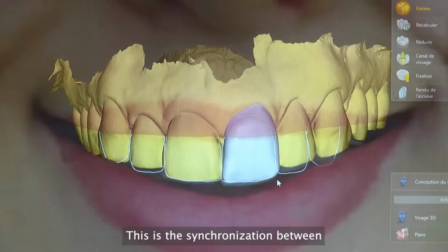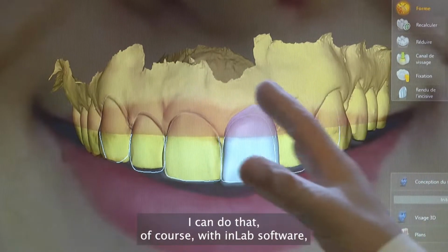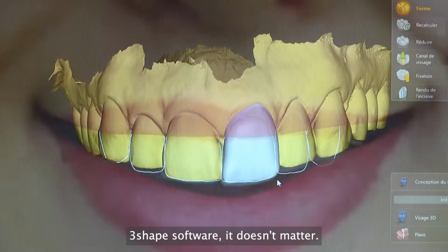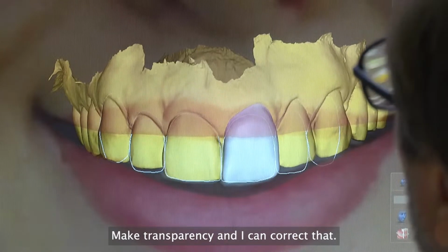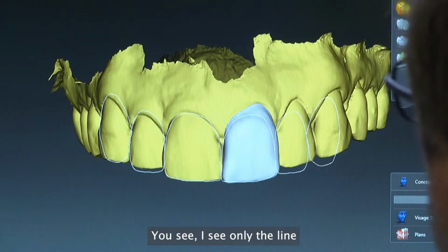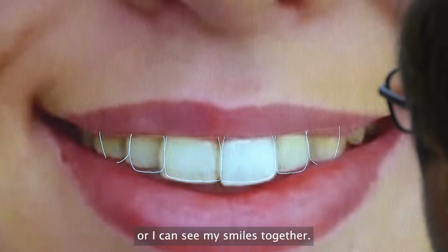This is the synchronization between the 2D and the 3D. I can do that, of course, with inLab software. I can do that with the exocad software, 3Shape software. It doesn't matter. It's only one layer and another layer, make transparency, and I can correct that. You see, I see only the line, or I can see my smile together.